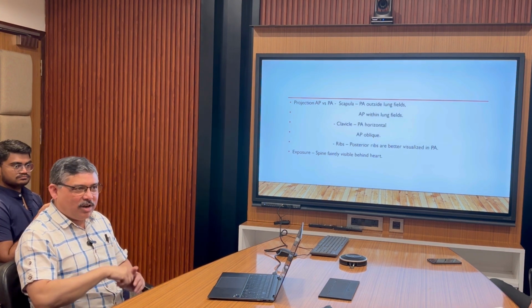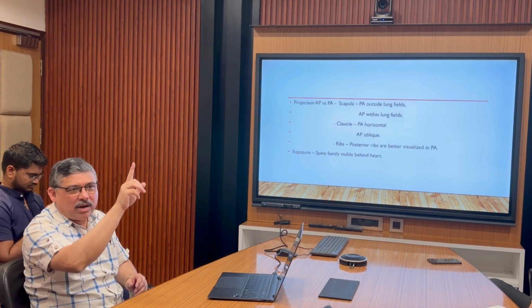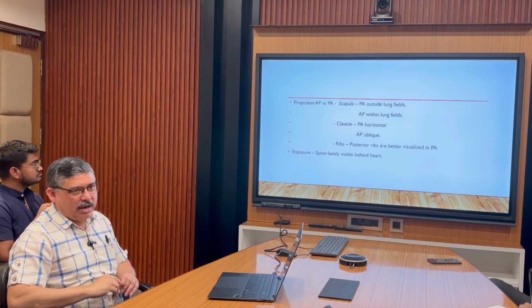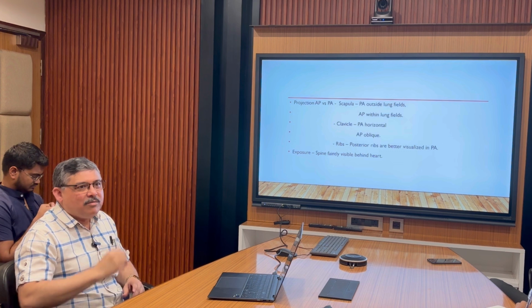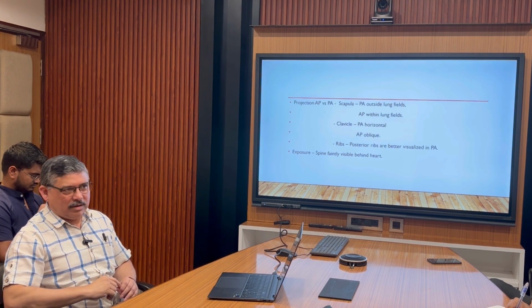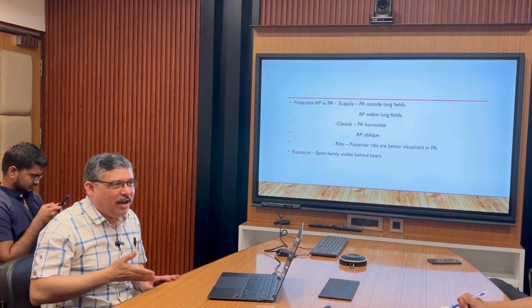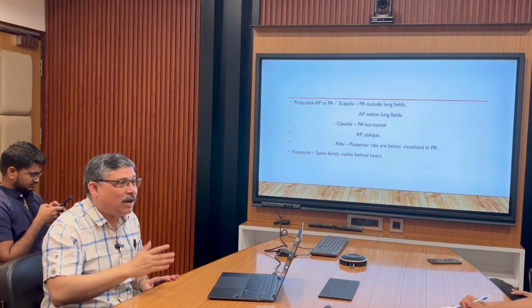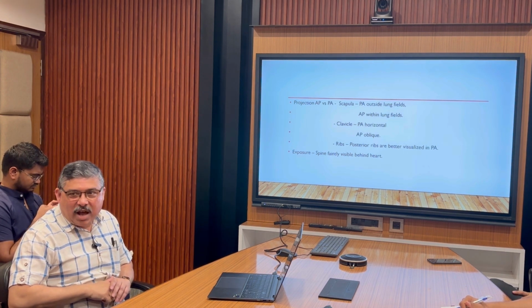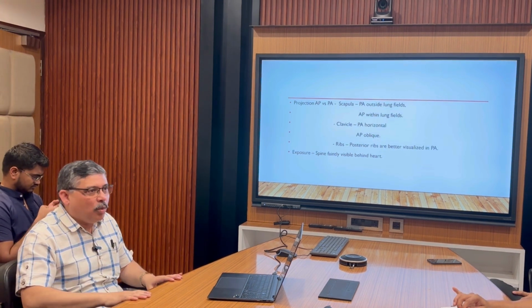Okay. How do you know the exposure of the film? Overexposure and underexposure. So when you see the thoracic spinal shadows, up to the fourth thoracic spine, it should be well visualized. Beyond the fourth thoracic spine, the spines should be very faint. If the whole spine and the spinous processes are visible, then you know the exposure was more, so the lungs will look more black, and the smaller details will go.